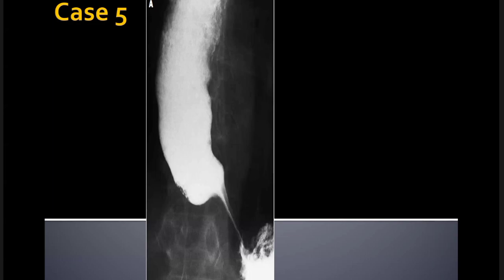And this diagnosis can be confirmed by esophageal manometry or endoscopy. And further, we can refer the patient for endoscopy, and a CT scan can also be done in this case, which will show smooth concentric narrowing of the distal esophageal gastroesophageal junction without any surrounding infiltrative changes and lymphadenopathy. So my diagnosis in this case is achalasia cardia.